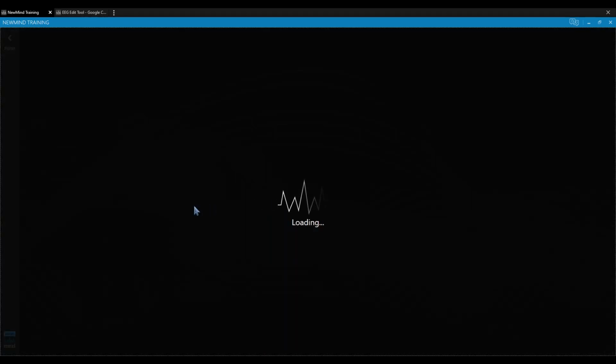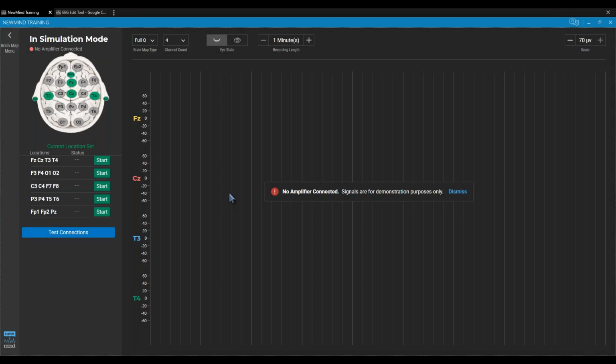And you'll have to use your own experience while you're watching those signals and seeing all the artifact, trying to put together how much clean signal have I seen comparatively to artifact? Because that's going to tell you how much time you're going to need to add in, because you're going to have to shut off that auto artifact detection.